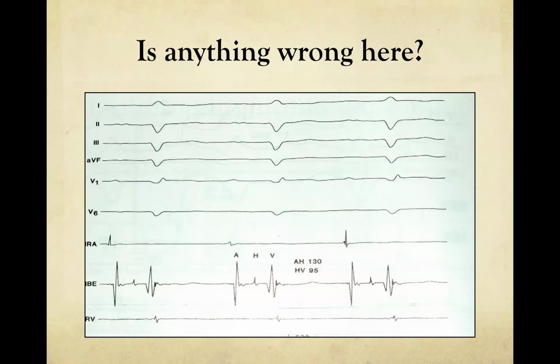And we would expect that this looks like spontaneous sinus rhythm. I'm going to make a prediction that if we were to pace this patient at any kind of rate above 100, there likely would be some form of block seen, whether at the AV node or the infrahisian position. But this is somebody who clearly has conduction disease of some sort. Okay, good.